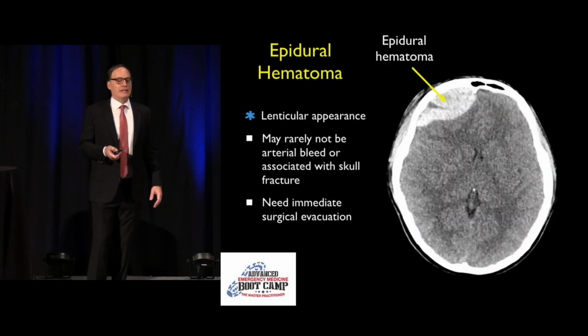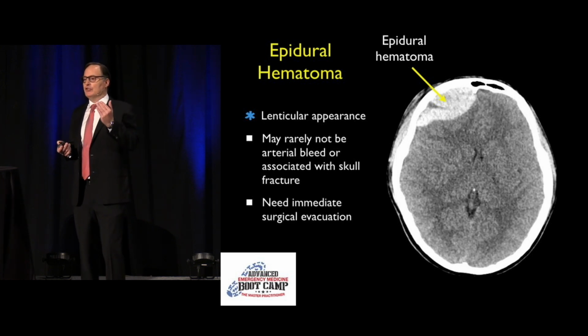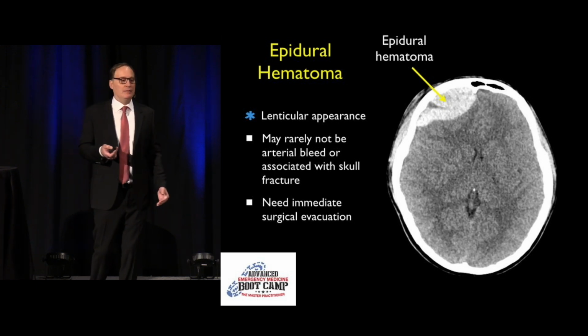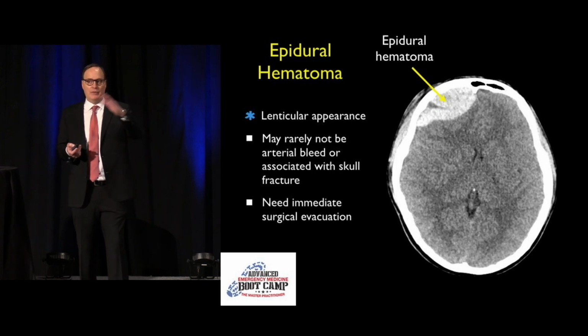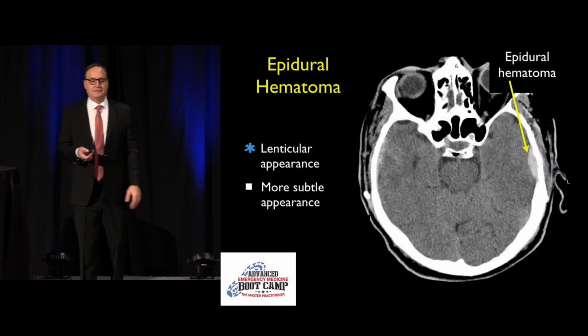This is an interesting one. This patient actually did not have a skull fracture, but got hit with a projectile with such force that this patient developed an epidural hematoma. And you can see it looks very different than when we come through and look at some subdurals. This is much more lens-like appearing.